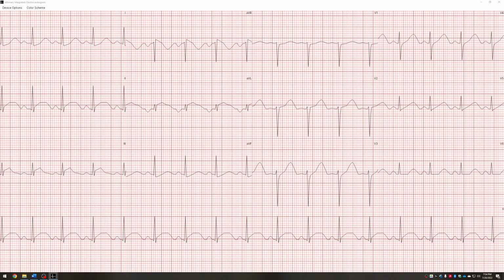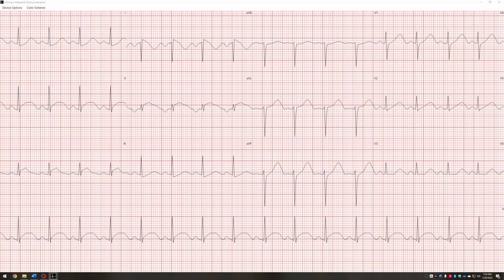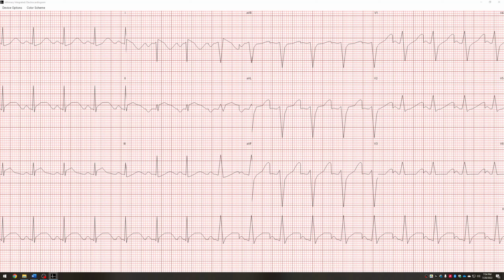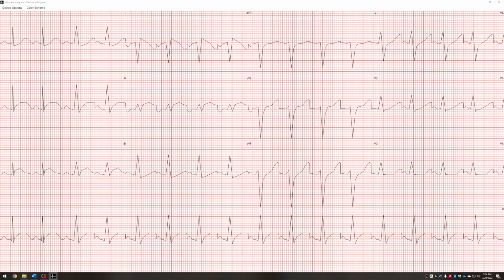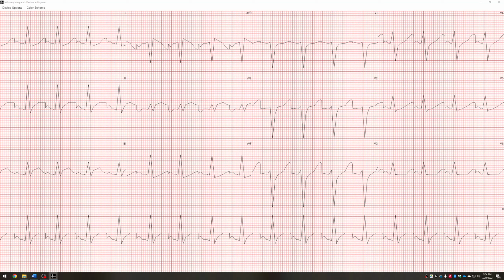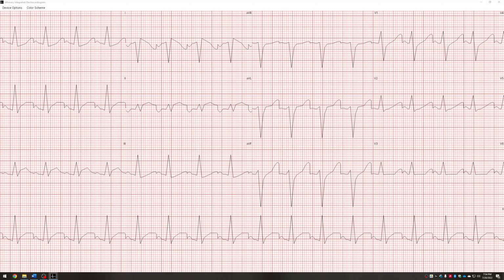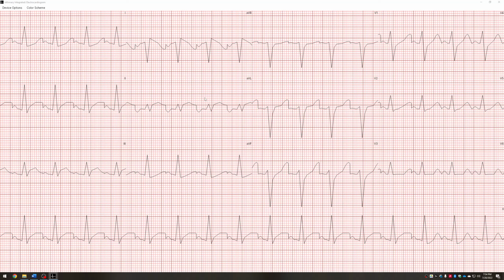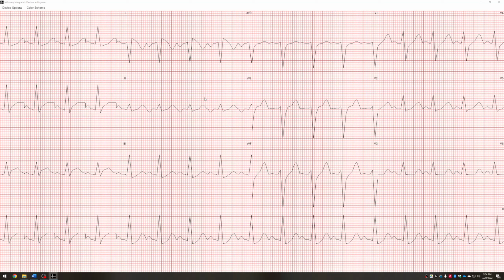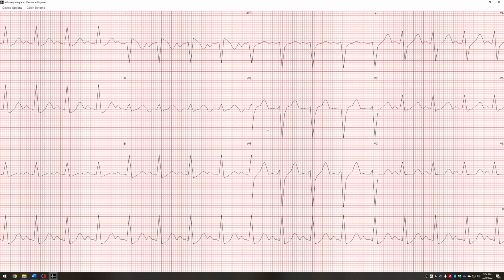And for example, I'm going to start to make a wide complex with a very long QTC interval, and it's going to start drawing from the right side of the screen. In fact, it is possible to adjust the cardiac parameters so much that they look unrealistic and that the drawings do fall into unrealistic territory. So I'm going to back down on the QTC interval, and it should start to draw a much more realistic waveform. There we go.